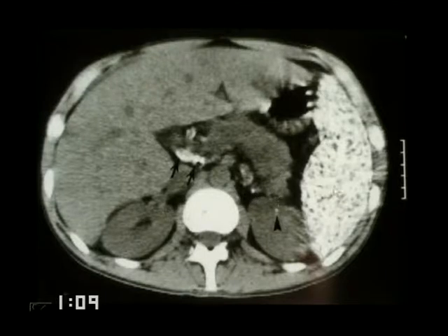But the spleen, this is the most profound example I've seen of splenic calcification, and it's the only entity I've seen give this unusual, bizarre, dense pattern of linear, thick structures crisscrossing the spleen, pneumocystis carinii. As opposed to a case like this, where the spleen is small, is heterogeneously dense but calcified.